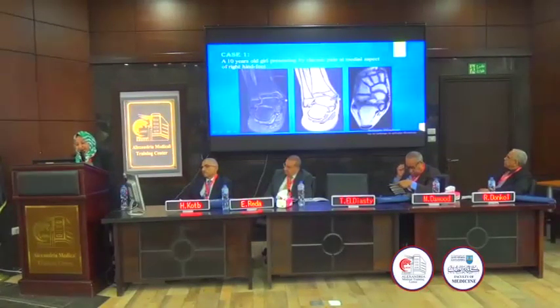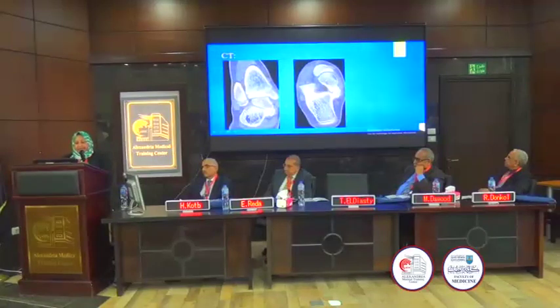There was an unfused ossicle here, and it was nicely demonstrated by the T1 coronal and axial images. The referring physician insisted on doing CT to better demonstrate and confirm the presence of this ossicle, which is interposed between the sustentaculum tali and the middle subtalar facet of the middle subtalar joint.